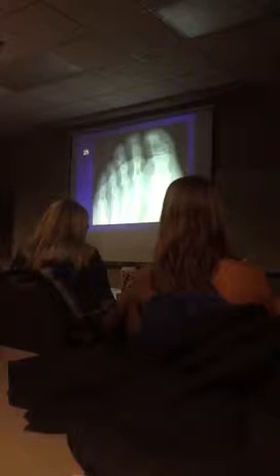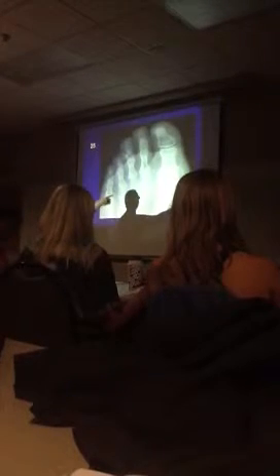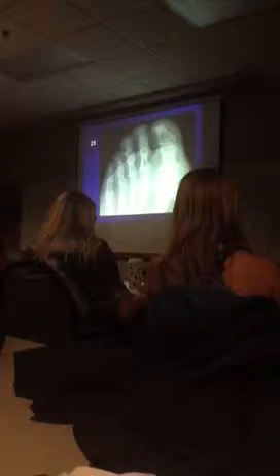What do we have here? We have a monoarticular arthritis, and there's irregular joint space loss, but in addition to that, there are also these little overhanging edge signs right here. That is crystals grinding away at a slow rate, allowing the bone to try to reform. That's what the overhanging edges are. We also see large soft tissue swelling in here. So that is our old lumpy, bumpy joint disease: gout.